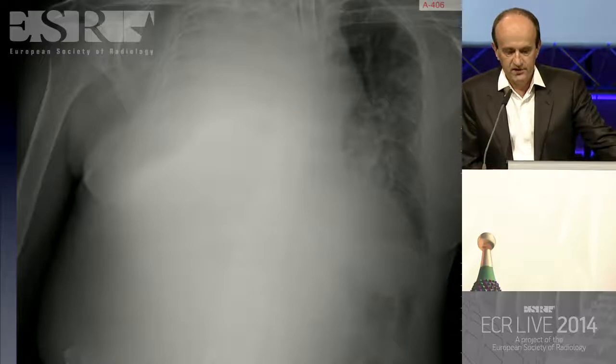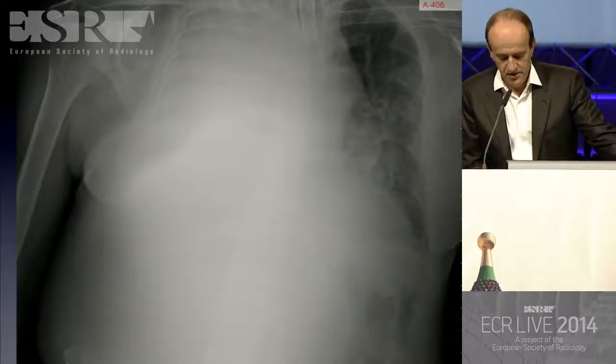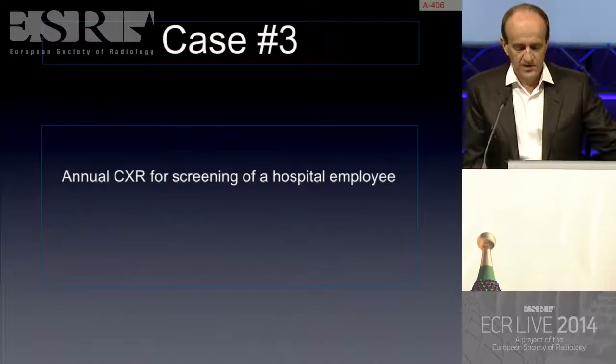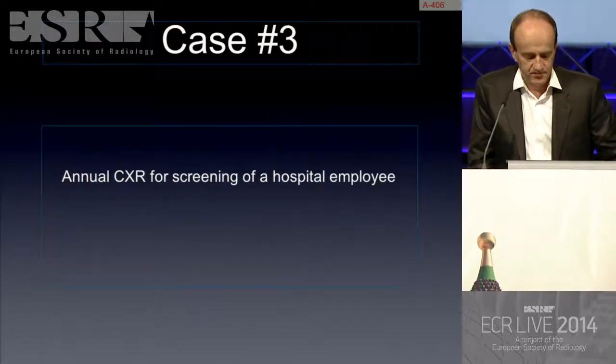Looking at the radiographs again, it's quite difficult to identify with certainty the right and the left side. Maybe the air in the left flank more likely corresponds to the descending and not the ascending colon. Okay, so beware technical conditions.